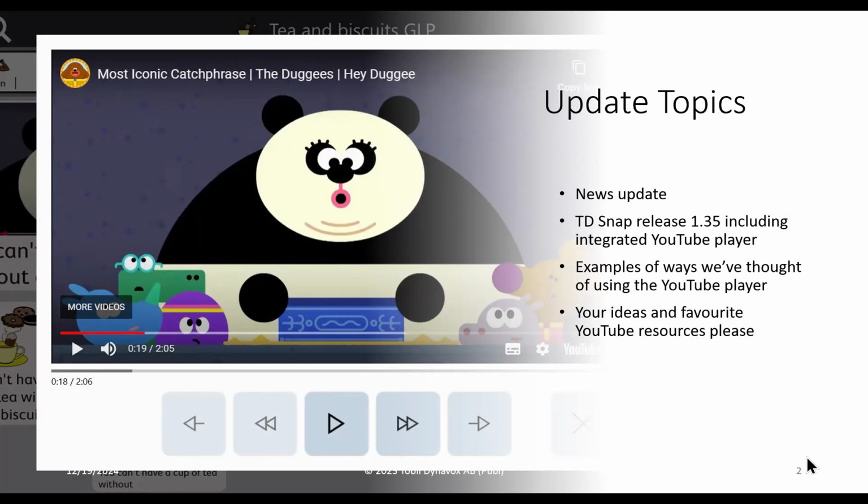But the big thing we're going to spend time talking about is the integrated YouTube player. We're going to show you how it works and then show you examples we've thought of for how we can use the YouTube player, perhaps for more clinical and language learning reasons.